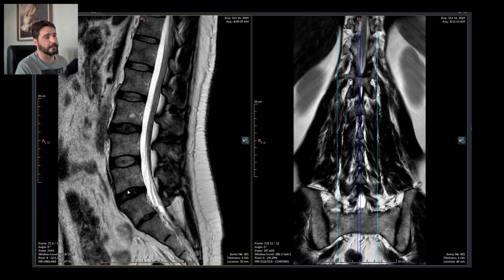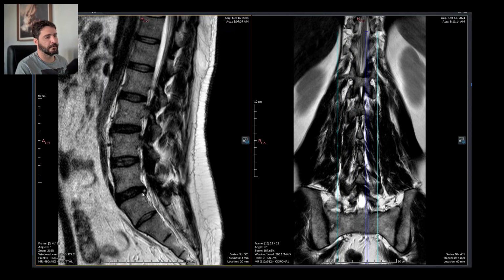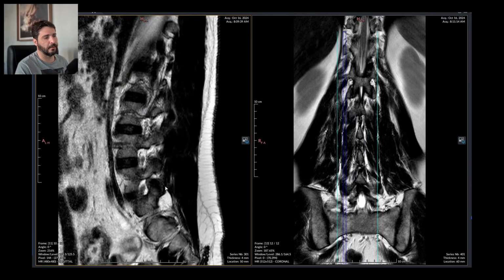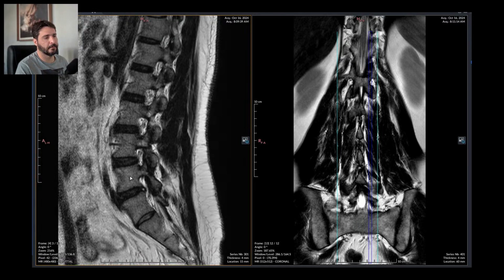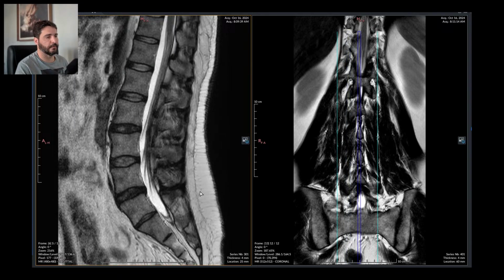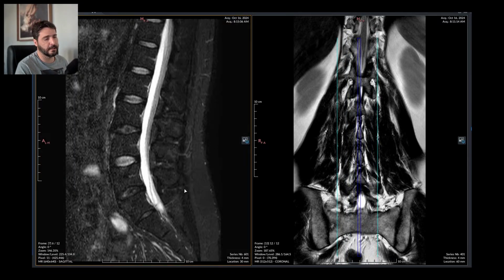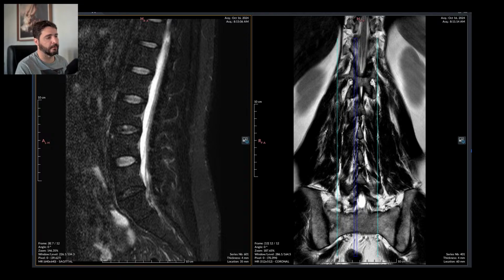And indeed, as you guys can see, the worst disc of all is this one, and this is the only one with a slight protruded disc. Nothing much, but indeed there is a protrusion. And there is also a rupture of the annular ring, the annulus fibrosus. So this could be painful. And there is arthrosis. Let's see if there is any kind of synovitis. Can't really tell. No edema, no joint effusion, just plain old arthrosis.